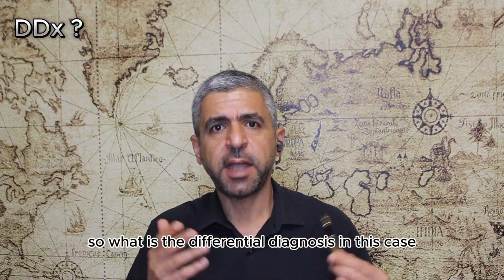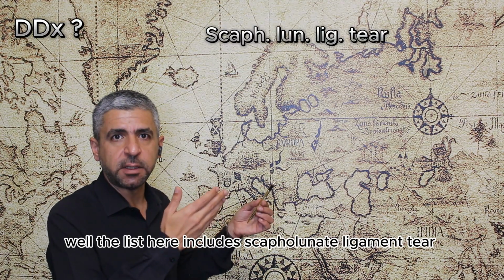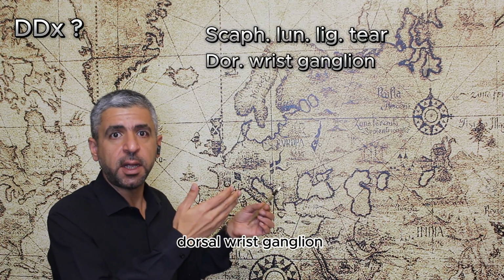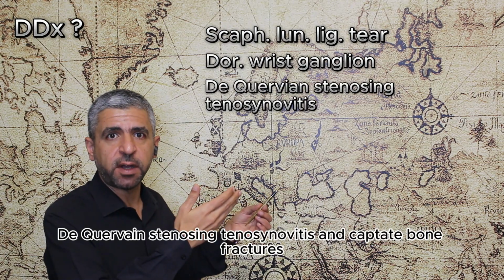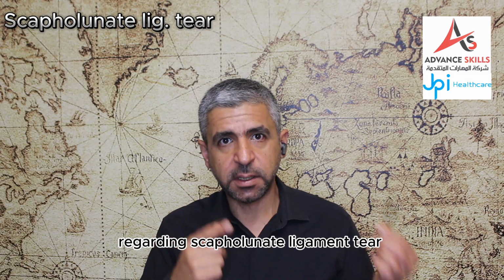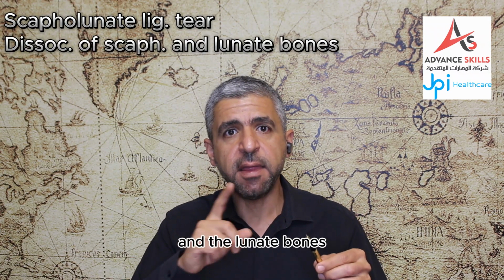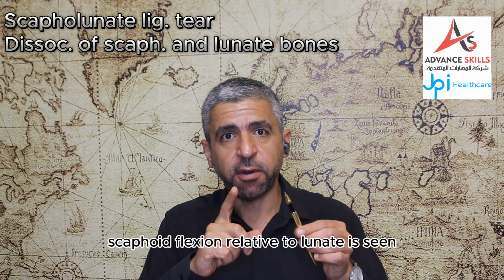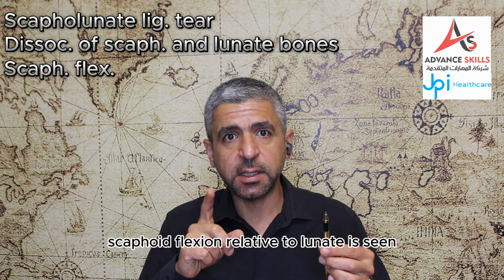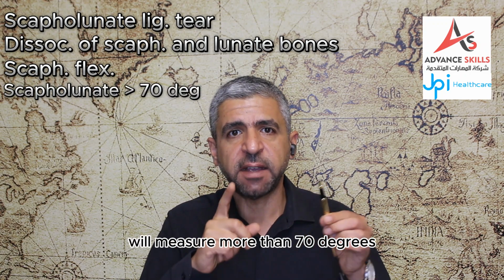So what's the differential diagnosis in this case? Well, the list here includes scapholunate ligament tear, dorsal wrist ganglion, de Quervain stenosing tenosynovitis, and capitate bone fractures. Regarding scapholunate ligament tear, there will be dissociation between the scaphoid and the lunate bones. Scaphoid flexion relative to the lunate is seen, and the scapholunate angle will measure more than 70 degrees.